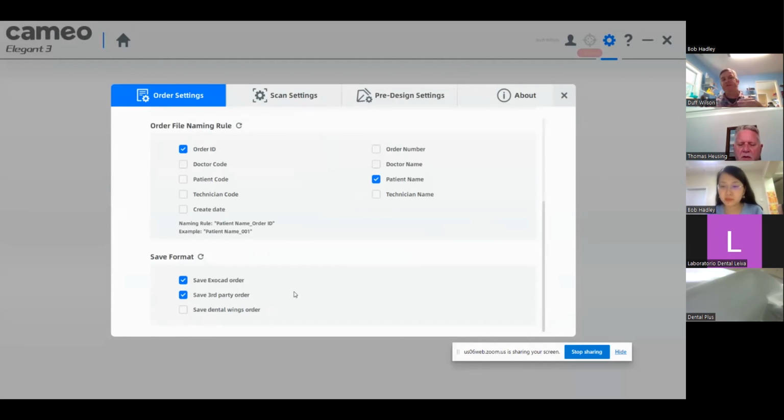So what I've noticed on my side of the portal in the lab portion is under third party, it'll have color for 3Shape and non-color for 3Shape. And so you would be able to pull those and load them in your system. And it normally goes ahead and loads your patient name, your data and stuff like that. It'll fill basic information out into your normal lab software.